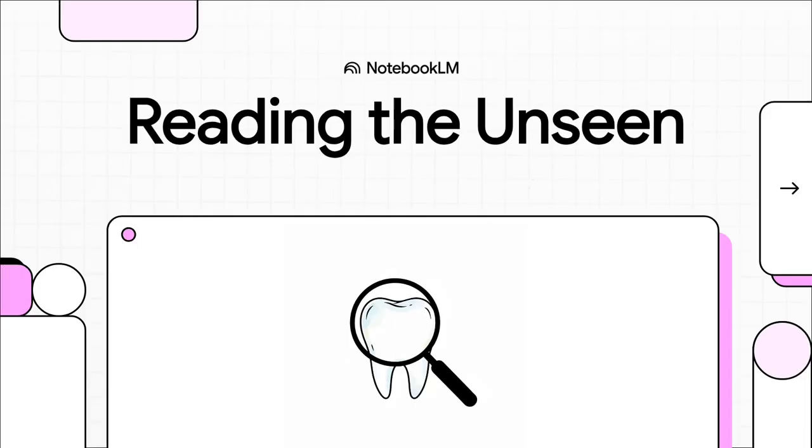Today, we're learning how to read the hidden stories in dental X-rays. What looks like a simple black and white image is actually a really detailed diagnostic map. And by the end of this, you'll know the basics of how to read it.